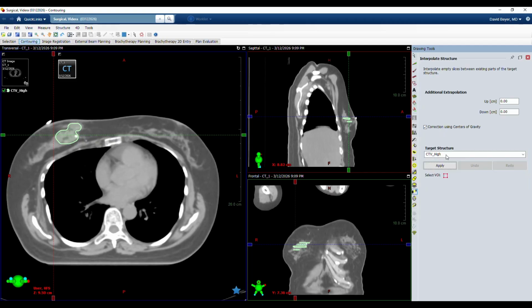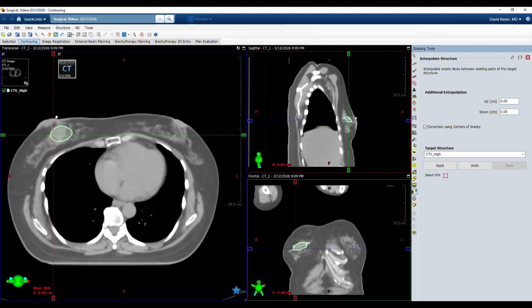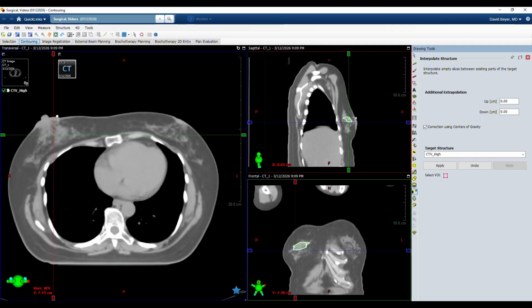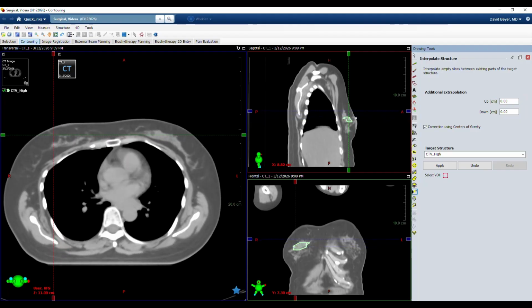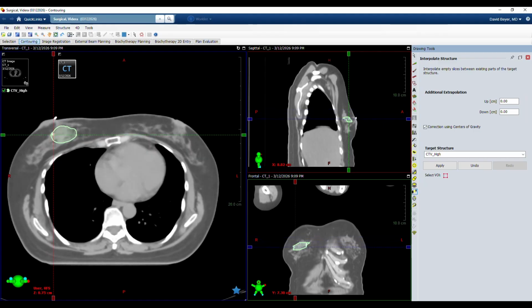I'm going to interpolate this and just show you what I've come up with. And once again, is that the edge? Is this part of it or not? Really hard to tell. And part of the reason is I've just got a few clips that don't really define a volume. They define a couple of points in a plane, but very hard to know.